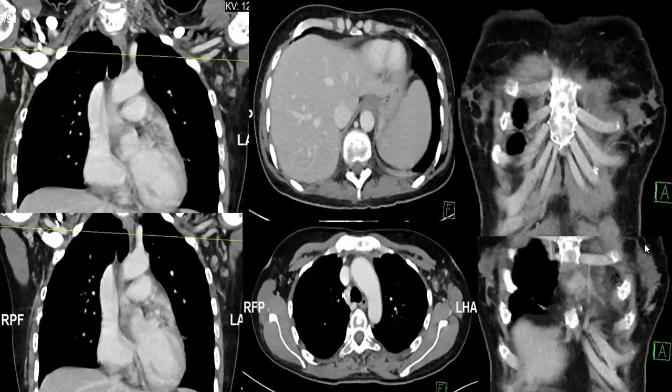You see this lesion, with surrounding subtle distortion corresponding to that area seen on mammography. When they showed this image, we raised the suspicion that this lady most likely has a primary left breast cancer with axillary lymph nodes.